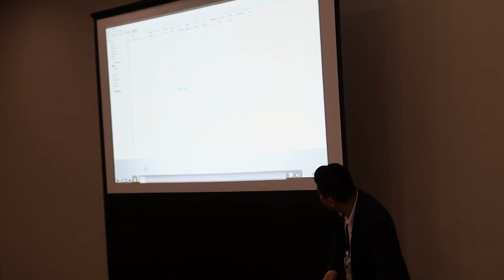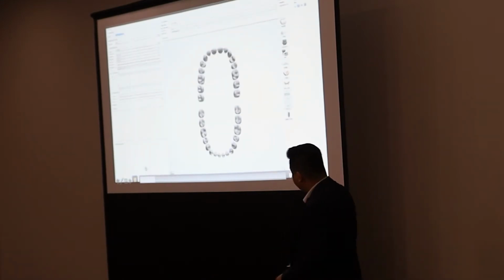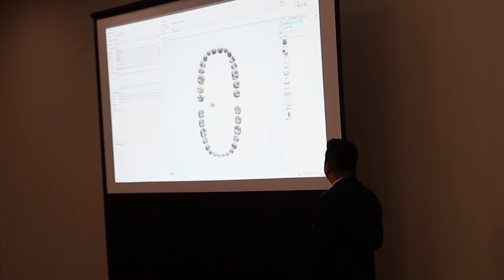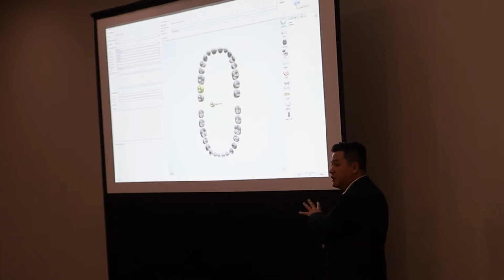So we set our order form, set it as a single unit temporary unprepared model. And the reason, again, that I set just a single unit here is because we don't really care what the indication is. We just want to put some data in there, use this order form, and get that data out.